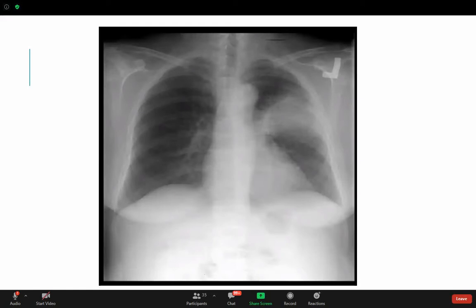Okay, someone is trying, saying left lung, lower lobe consolidation. I like that. It's not in the lower actually. It's probably in the upper. And don't forget the left lung only has upper and lower. They don't have middle. Okay. That's good. So consolidation in the upper zone of the lung. Okay, that's very nice. And what are the differential diagnoses for that?